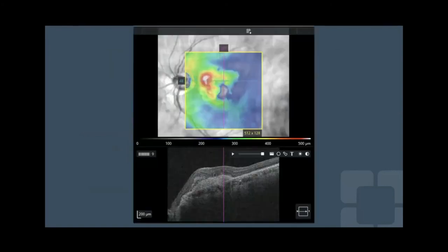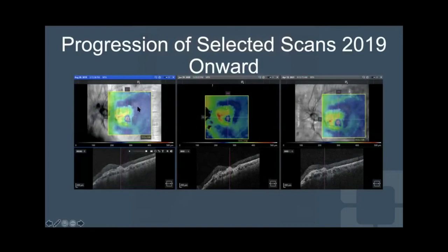One of the other big biomarkers that you can see in patients with neovascular AMD is ORT, or outer retinal tubulation. And here's an example patient with a neovascular complex, which I've treated with multiple anti-VEGF injections. Here you can see the neovascularization complex. Just above it, you see the outer retinal tubulation. And people sometimes confuse this for a cystoid, and they might start to inject this patient over time. But what you can see in this patient is that from August 2019 to almost April, this patient has maintained the same central subfield thickness alongside this ORT picture.